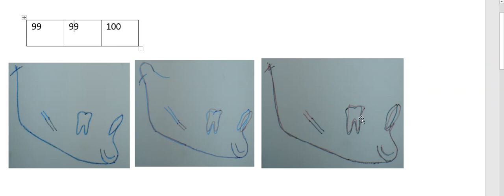Now in the final superimposition, if you see, the molars are mesialized, which is good because it correlates with this superimposition. The molars are extruded, but the molars in the mid treatment, from mid to final, seem more extruded than here in the final superimposition. So they should ideally extrude to the same levels, because here there is no change, so you are supposed to show the same change in the molars from the mid and in the final superimposition.